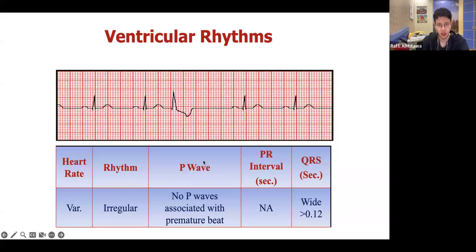Yeah. Okay. Now we're going to look at this. What do you guys see here? Right? T-wave problem, maybe. Someone said PVC. Two people said PVC. Okay. So if you look at this over here, remember, this looks like a normal PQRST. This looks like a normal PQRS.